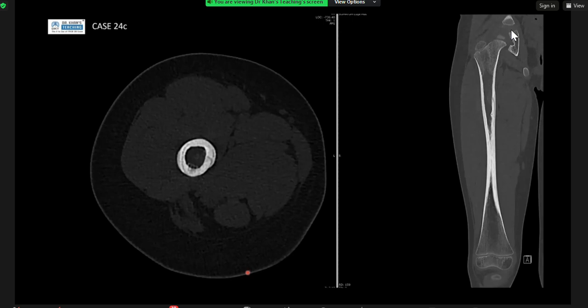Would osteopetrosis just affect a single bone in a single site? It would be more systemic, multi-system. Think about one of your differentials you mentioned earlier. And remember, it probably took some delay because the clinicians didn't want an urgent CT scan. They said, do it when the next available. So you've got some time in between the MR and the CT, maybe 2 weeks. So there is a tract communicating to the superficial. So this could be osteomyelitis.